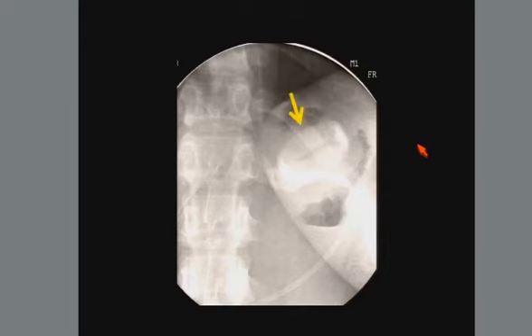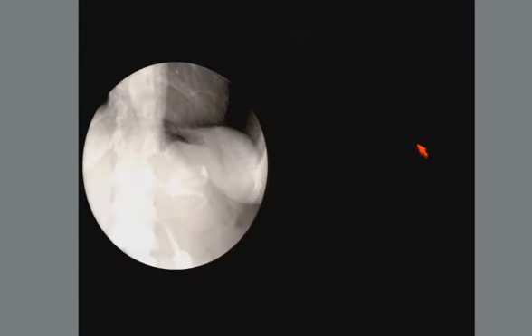This is a patient that demonstrates a band, the O sign, which is another finding of a slipped band. Instead of appearing as a bar, it looks more like an O. This is another patient that also has a partial O sign, but note the band is more than 2.4 centimeters below the hemidiaphragm, or twice the width of the band.